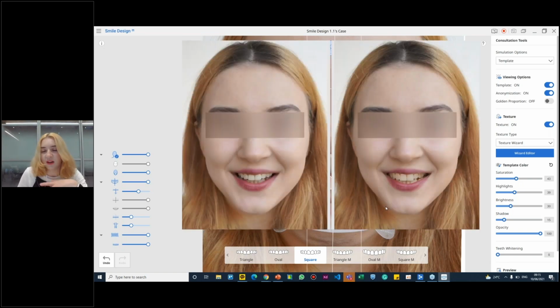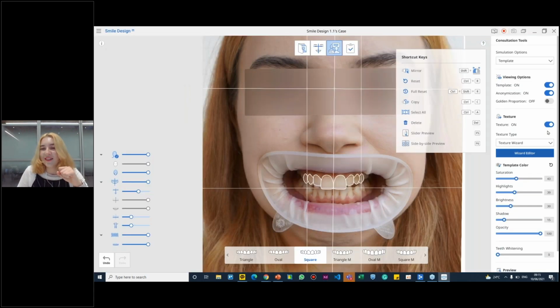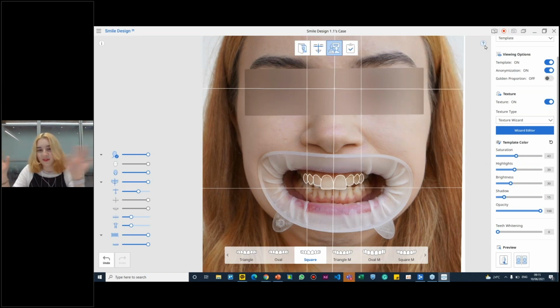So it's this process where you constantly keep changing and looking at the results. Now, where do you hit preview? And everyone probably saw that. So there are 2 preview options here at the bottom, but we also provide the shortcut, so F5 and F6 to see the preview.